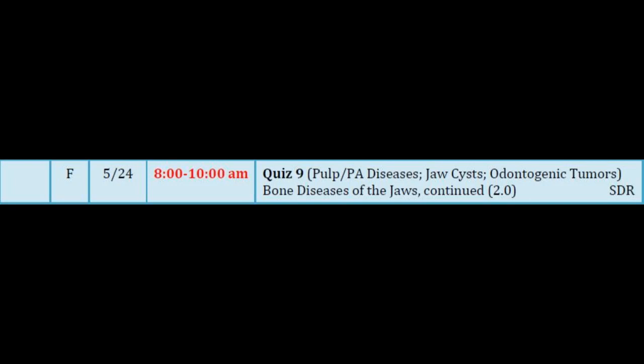But when we're in this blastic stage and are starting to form hard tissue, the radiographic lesion is going to be mixed. It's going to have some areas of opacity, more toward the middle. It's kind of a mixed opacity. It's not uniform, solid whiteout. It's kind of irregular, but it always has a radiolucent rim around it. And as it matures, the rim gets smaller and smaller, and the mixed part kind of gets bigger and bigger. The mature final stage, which then lasts for years and years, is an opacity that retains at least a partial radiolucent rim. Maybe a thin radiolucent rim. It may not be a complete radiolucent rim, but there will be at least a partial radiolucent rim around the opacity.